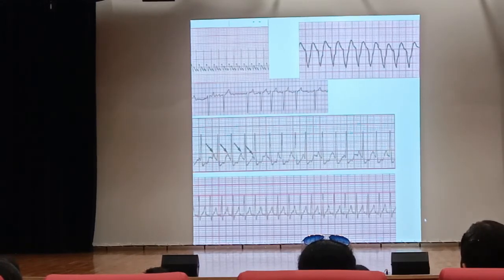This ECG? Anyone? Very simple. P wave दिख रही? नहीं दिख रही है. QRS complex दिख रहे हैं? दिख रहे हैं. Wide है. तो कहाँ से origin हो रही है? Ventricle. So heart rate more than 100 है. तो क्या कहेंगे इसको? Ventricular tachycardia. So this is how we need to learn to identify ECG.